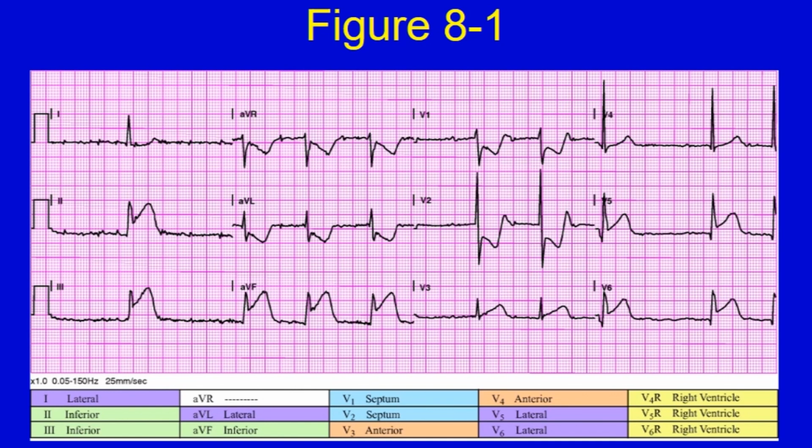Okay. Now, reciprocal changes, meaning ST depression. Which ones have that? AVR does. I'm going to tell you, we really kind of do 11 leads for the most part, but sometimes when AVR is involved, it just means it's that much worse. Okay? AVL, definitely.